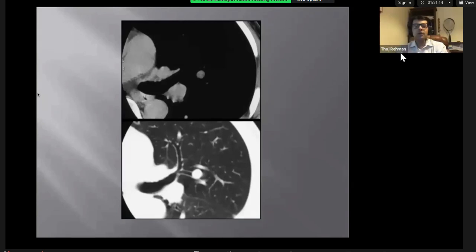Exactly. So if it was an extrabronchial abnormality, you would expect the nodule to press on the outer wall of the bronchus, and to narrow the bronchial lumen, isn't it? If something pushes the wall from one side, it will narrow the lumen. But here, the lumen is patent, which means it is arising inside the lumen and growing out. Yeah, that is a very good diagnosis.